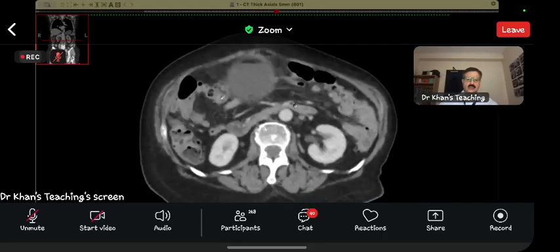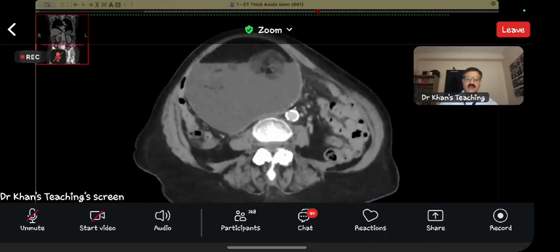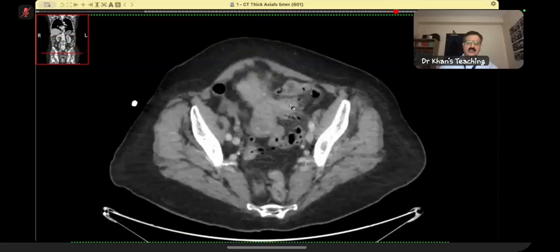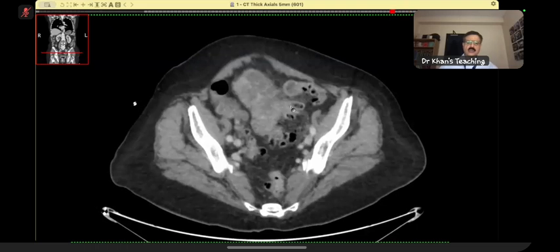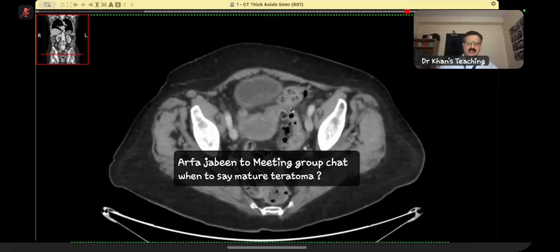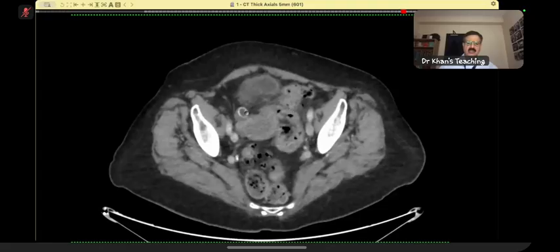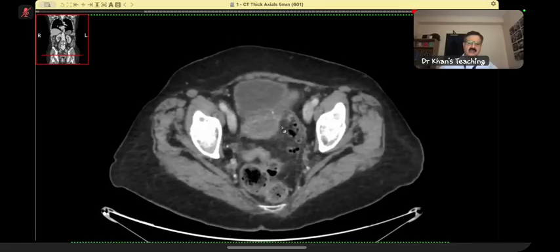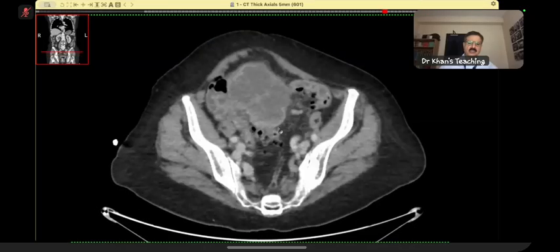So I will show you a CT scan, because you can get this on a CT scan also. In immature teratomas, usually there is rupture and this goes into the peritoneum, so always look for that. In this particular case, there is some calcification here, but this was not fatty inside it, and it might be a slightly chronic type of deposit sitting there.